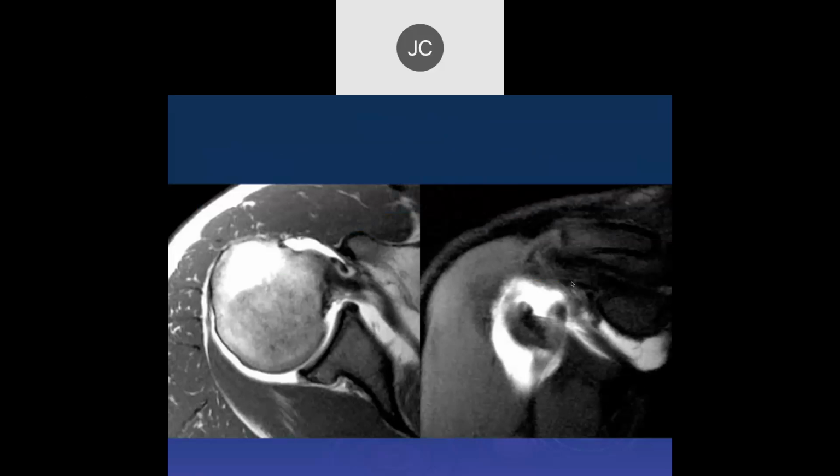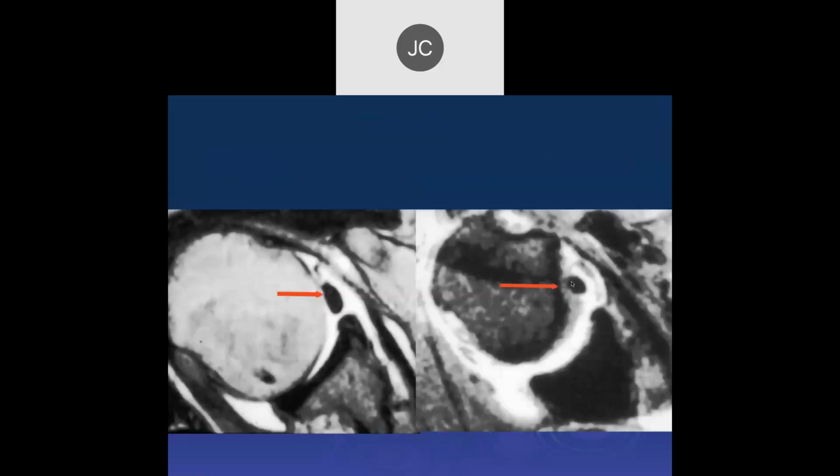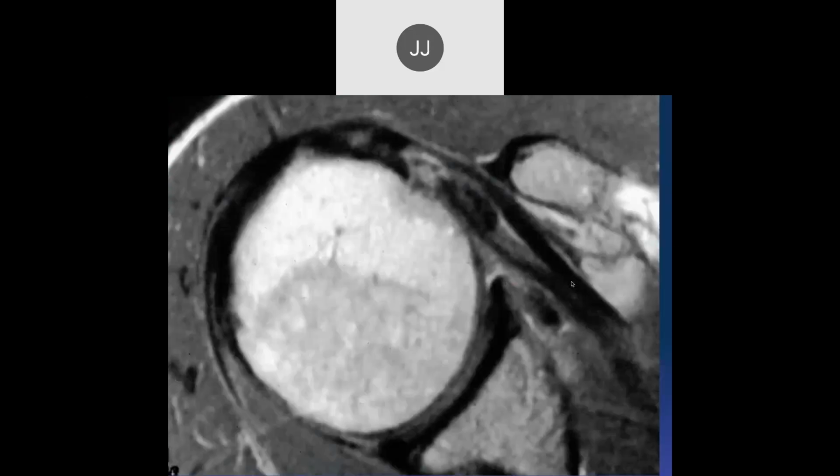Ready? Well, John, yes, it would have to tear the fibers all the way to be able to get there. No. See, John, initially what it does, the biceps subluxes into the substance of the subscapularis. The superficial fibers are still intact here. Then the pull is this way on the biceps tendon to the anchor that's over here, and it'll tear itself through the deep fibers, but these superficial fibers may still stay intact.